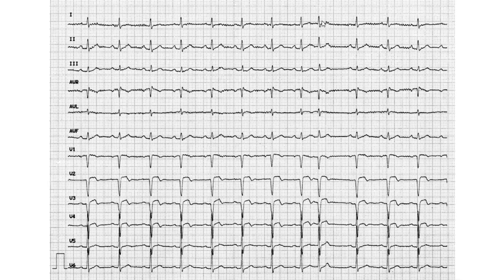Is there maybe some fibrillation that we're worried about? Well, technically speaking, look at lead 2. That's a P wave, P wave, P wave, P wave, P wave. These are all P waves. There's just something going on here. P, Q, R, S, T. And because this is an extrasystole, extrasystoles don't have P waves, by the way. So ignore this beat altogether, don't depend on it, and just skip it. P, Q, R, S, T, P, Q, R. So I see P waves everywhere. So actually, this is sinus rhythm.